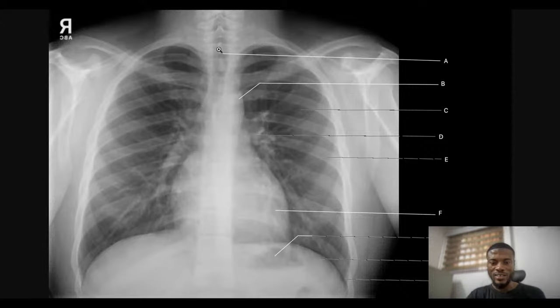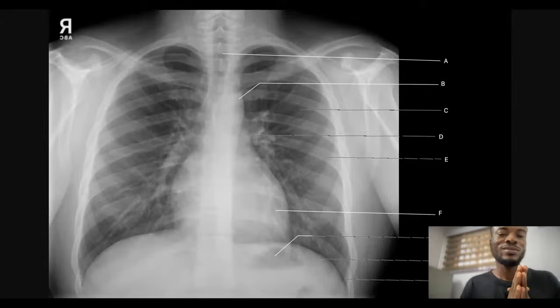We know that the trachea contains air. It's also called the windpipe. And for the trachea, we don't have right trachea and left trachea. Why? Because it is one organ. Any normal human being has only one trachea, right? And it's a midline structure as well. So don't write right trachea.